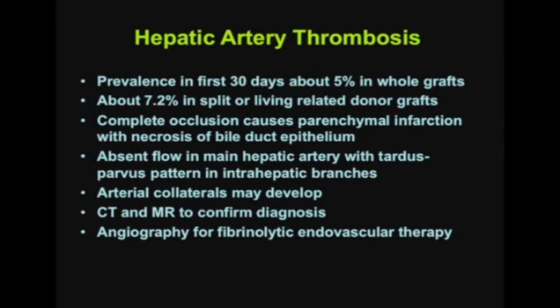CT or MRI are often necessary for confirmation of the diagnosis of thrombosis. These patients sometimes are taken immediately to surgery in the hopes of perhaps removing the clot. Sometimes angiography is performed as part of fibrinolytic endovascular therapy.